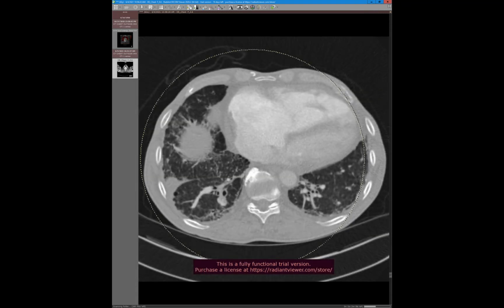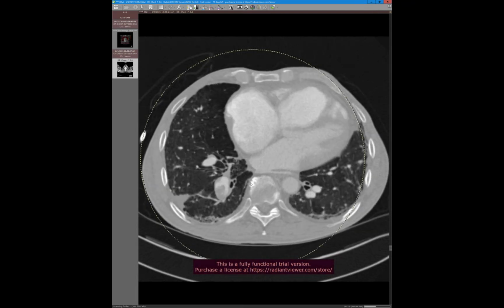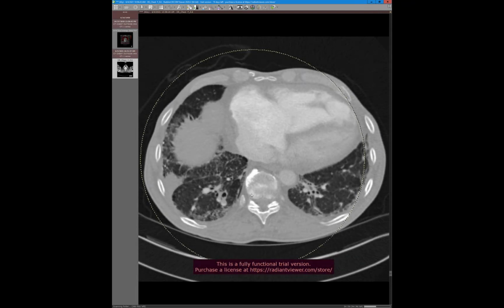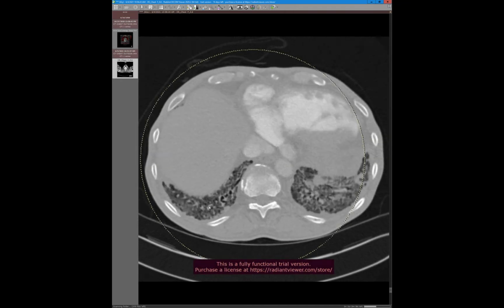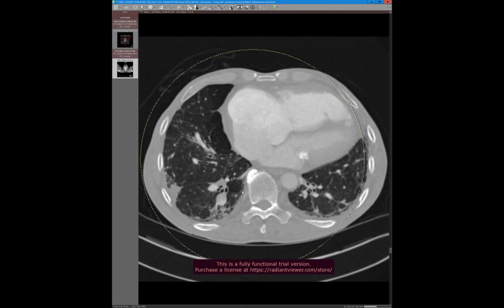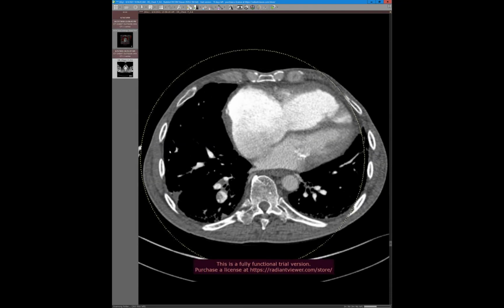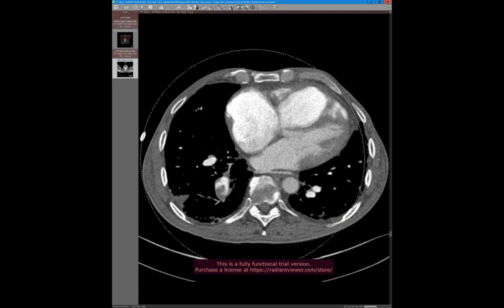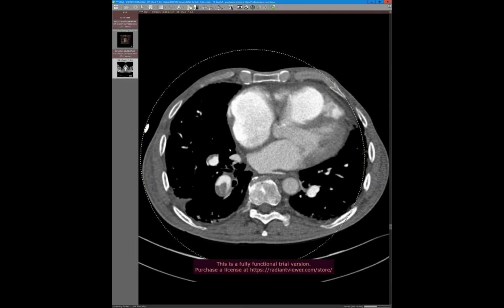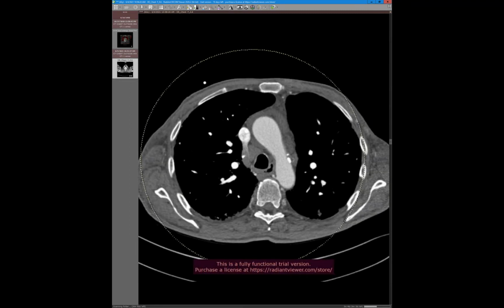And they're saying, even if it was, which they don't think it is, even if it was CTEPH, there's really no purpose to restoring flow to these lower lobes. I mean, they're just completely destroyed from the fibrosis. But this is a patient with known dermatomyositis with what our multidisciplinary consensus was to be layering mural thrombus, and it can be quite difficult.